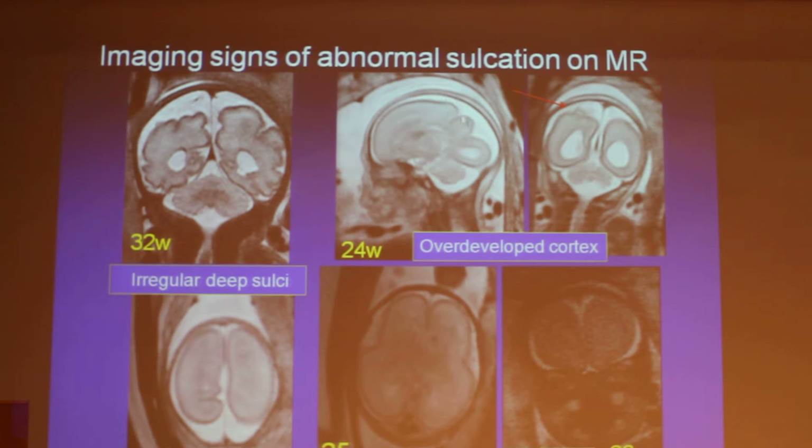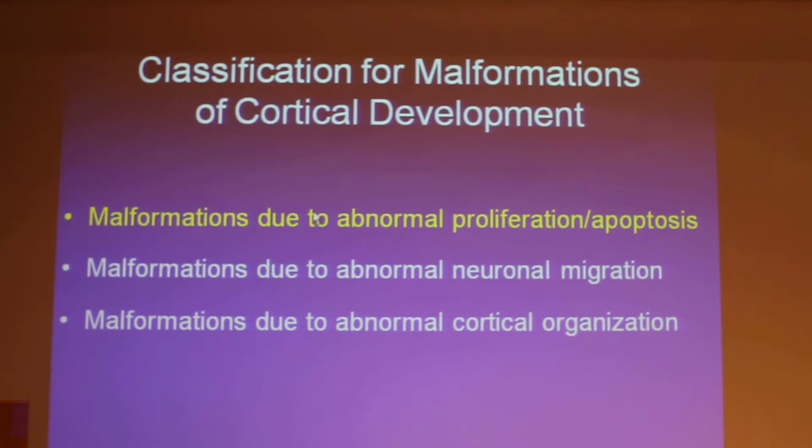At 24 weeks, you shouldn't have these broad abnormal sulcations. These are not normal sulcation. And suddenly you can just see an abnormal gyrus popping out, while it should be very smooth at 24 weeks of gestation. At 33 weeks of gestation, this is very abnormal to be so smooth and thick, and this is probably lissencephaly. Okay, so we'll try to go into the various groups.